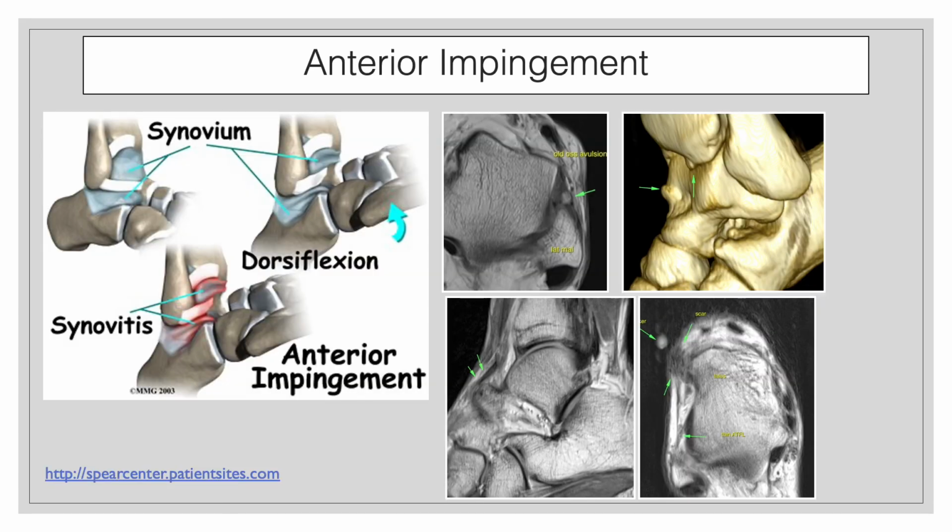So if you think about anterior impingement, you have a patient who has chronic ankle instability. They have anterior tibiotalar osseous spurring. That spurring can lead to, if big enough, a bony block. You can also have a bony avulsion that could lead to a bony block. But more importantly, you can also have bony proliferative change that can impinge on the traversing superficial peroneal neurovascular bundle. So remember, anterior impingement is not just about the bone causing a bony block. It's about that bone potentially impinging on adjacent structures, which could be tendons, very commonly the extensor digitorum tendon, or the superficial peroneal nerve, which runs in the same location.